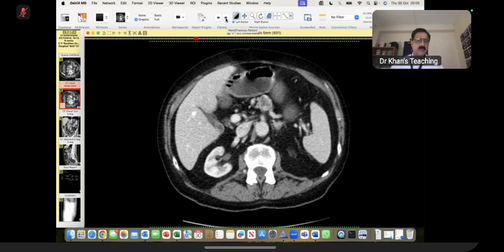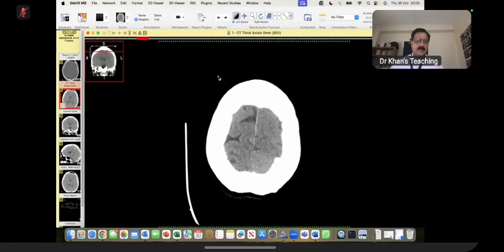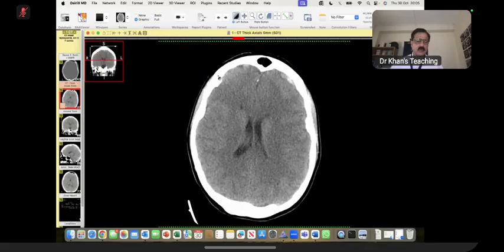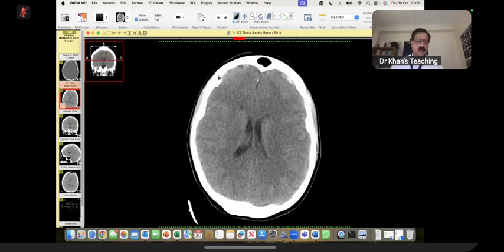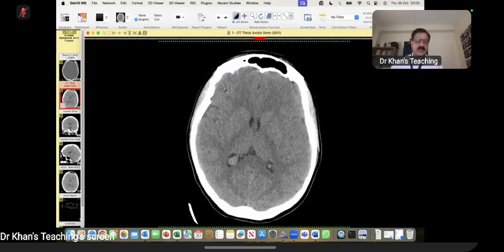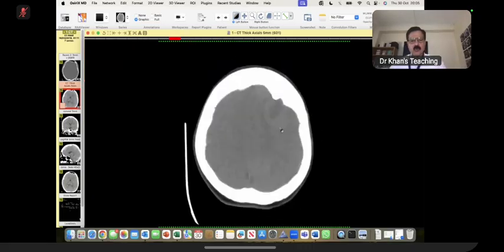I was not interrupting you just to see how you close the case, and you took too much time. Part of the problem in this case was that when I was asking you questions, maybe it was not projecting on your screen. Having said that, you picked up the meningiomas, which were fine. You could have asked for a bone window, because is there some hyperostosis here? And there was a bit of hyperostosis in this region.